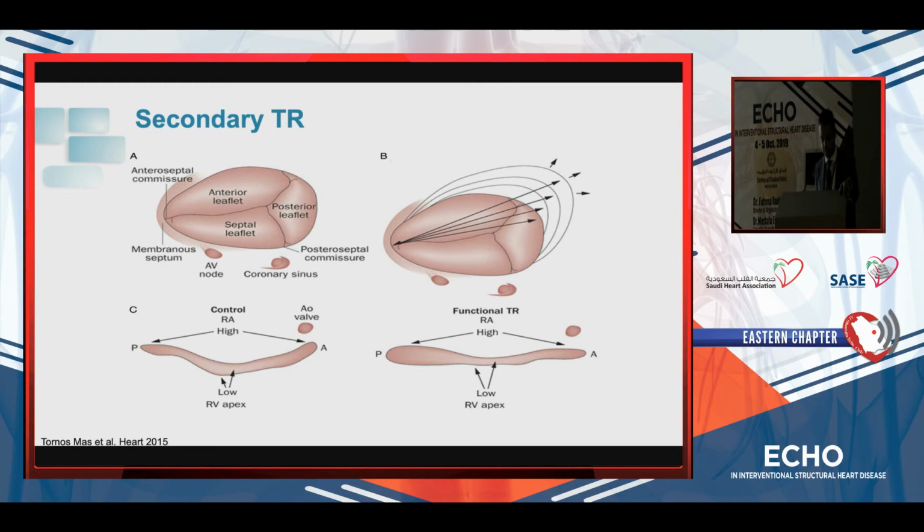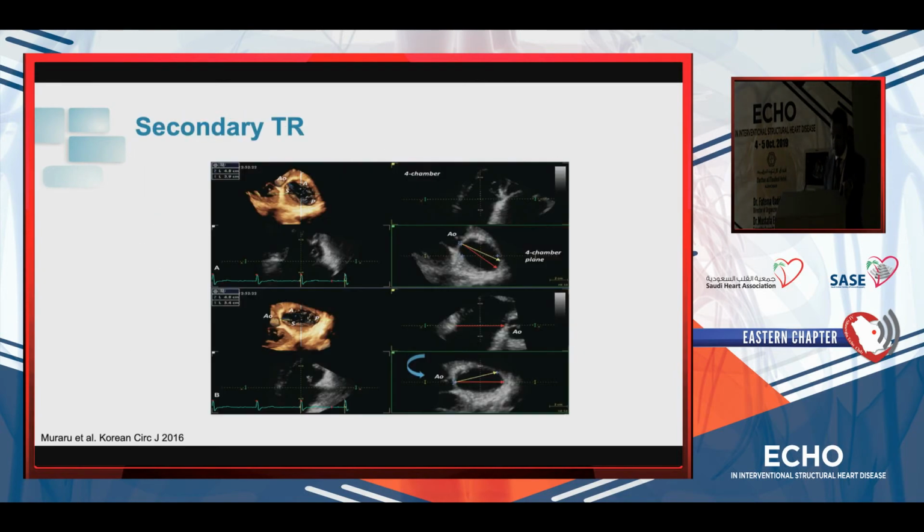you will see the tricuspid annulus gets more flat over time. And if you look at how to do measurements on echo, it's important that the standard views, when we do a measurement according to the guidelines in a 4-chamber view, is actually frequently not the biggest plane, the biggest annular dimension. So if you look at 3-dimensional imaging, and if we make a 4-chamber view and we cut, we can see we have a cut plane more or less like this, but we can see on the 3D image, actually the biggest diameter is more or less the red arrow.